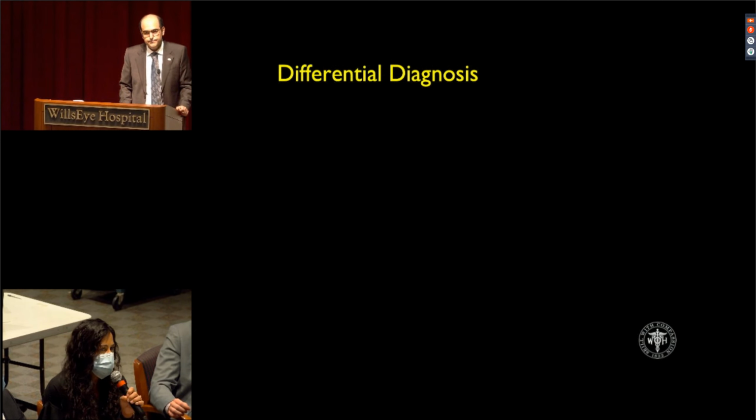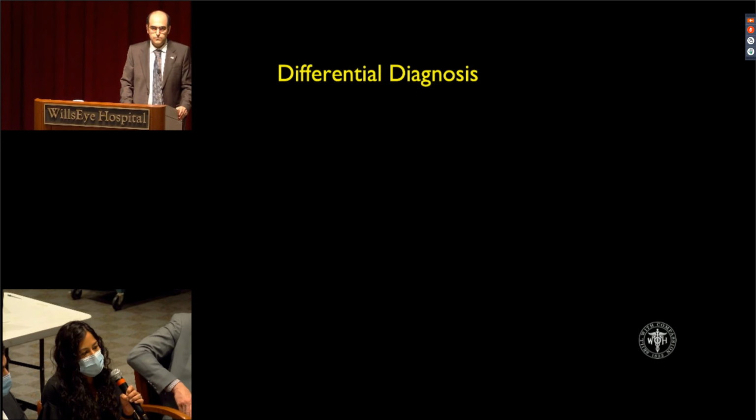Yeah, so this patient has a lot going on. So we have bilateral, central, chorioretinal scars with thinning, some cystic changes on the OCT, some hints of vascular activity in the right eye. So, thinking of things that cause CNV, you can think of AMD, myopic degeneration. It'd be unusual to have this bilaterally, but you always want to think of some type of trauma. And then old infectious processes like congenital toxoplasmosis.